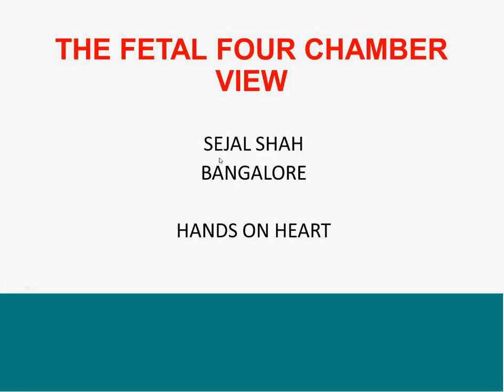Morning. Today we'll start the first of the series of fetal echo sessions, and today we are going to see the fetal four-chamber view. A little modification compared to what we do every year. Every year we have been starting with how to do simple basic steps for fetal echo, but we have decided to go step by step in detail. So today we will see the four-chamber view and see everything about it, the normals and the abnormals.